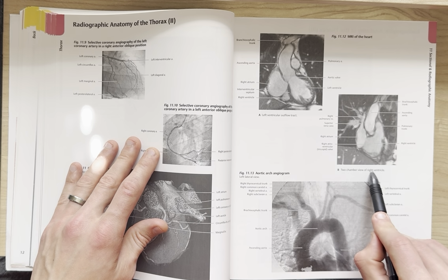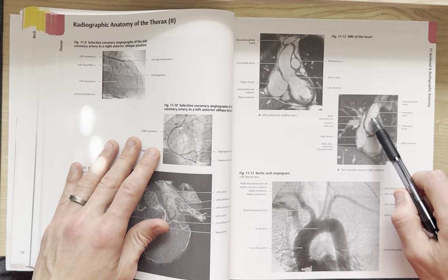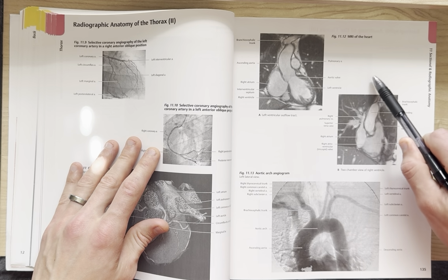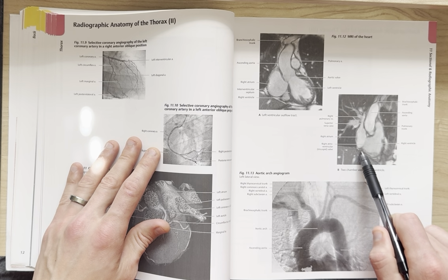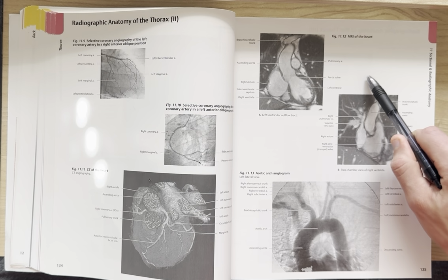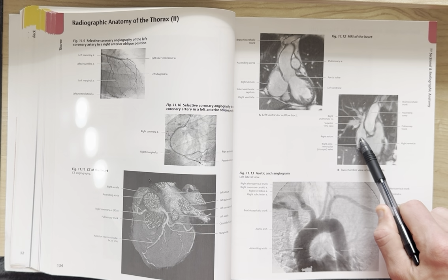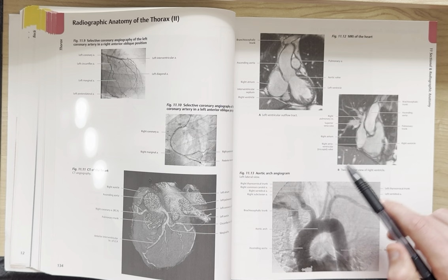Here's a two-chamber view of the right ventricle. So here's the right pulmonary veins. There's that superior vena cava, receiving blood going back down into the right atrium. Here's the tricuspid valve, which is going to be your cutoff point of dealing with blood going into the right ventricle. So deoxygenated blood coming through that superior vena cava, the right atrium, it waits a beat, and then it comes in through the right ventricle, and then it goes to be oxygenated.